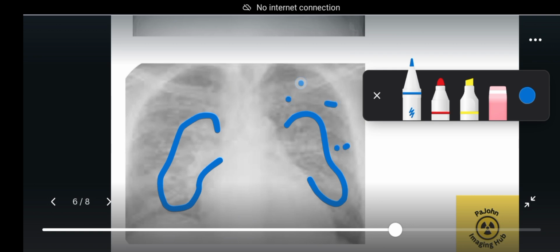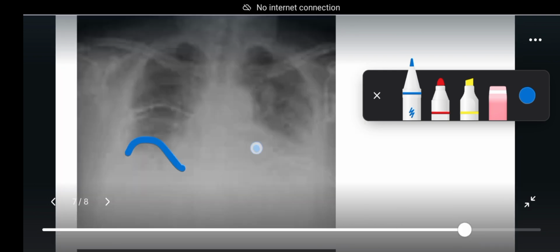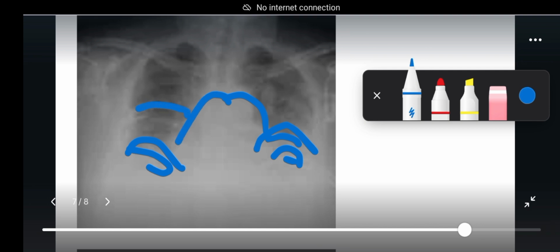You see how the inside of the lung looks hazy. This other image, you see fluid, see fluid. This fluid is a sign of pleural effusion. We cannot even make out the heart. Then you see this thickening of the fissure, or call it the horizontal fissure. It's thickening, so you see it appears thickened. Normally in X-rays you barely see it, but once it's thickened, it becomes visible. It's also a sign of pulmonary edema.